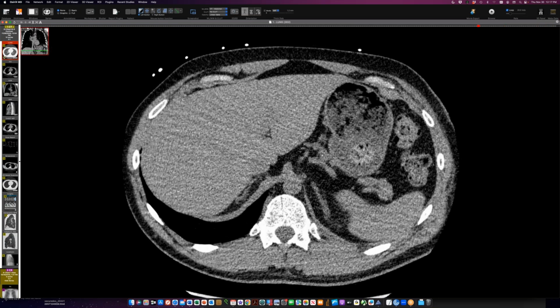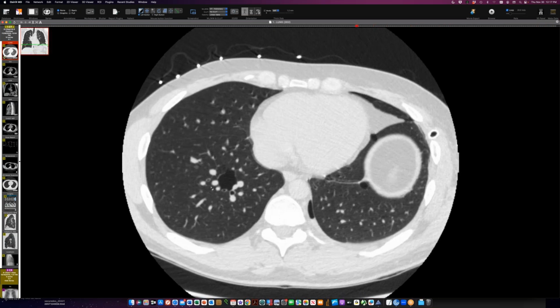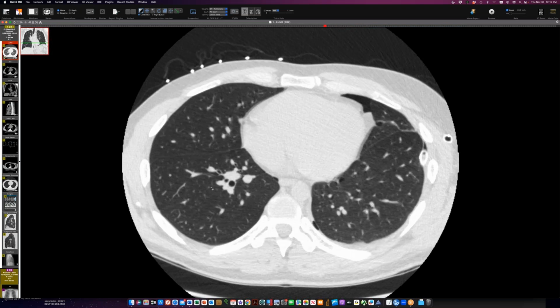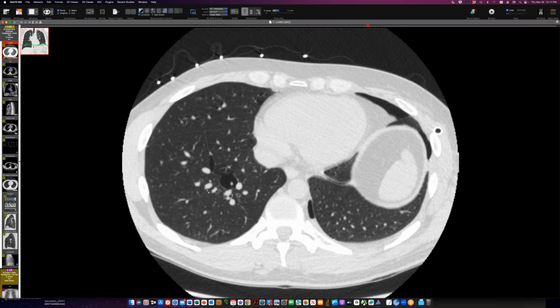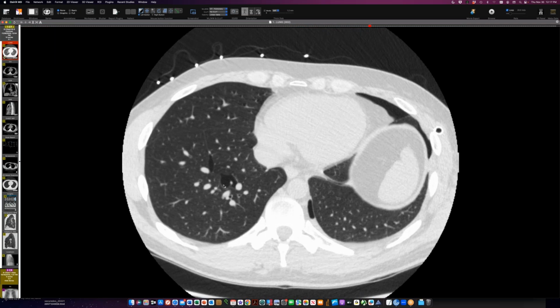So this is all Birt-Hogg-Dubé, with a strange shape to the cysts, including some lenticular ones, and the cysts often hugging septa and things like that. Sometimes they're called floppy cysts. I like that term. As in floppy disks. Most people don't know what those are, I bet. This person's currently in the hospital with another pneumothorax. That's why this case came to our attention.